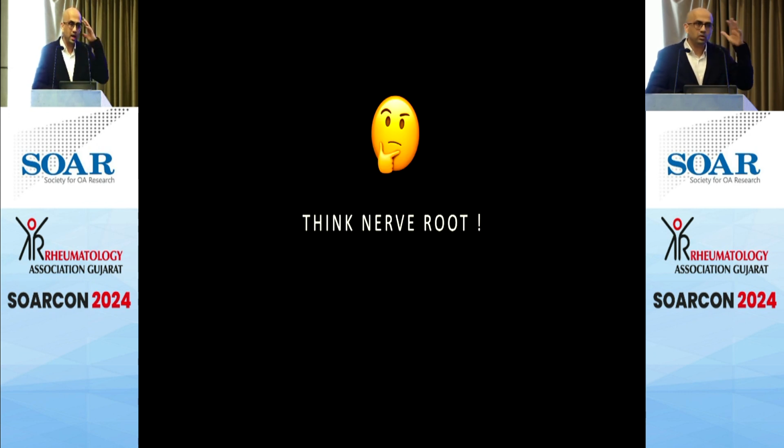So when I look at MRIs for a person with a neurological problem, I'm thinking of the nerve root. I'm not thinking of the disc or the disc herniation or the stenosis or what kind of degenerative changes they have. I'm thinking which nerve root is getting compressed. So you always think which nerve root, and can that nerve root cause that clinical syndrome, is what you are thinking in your mind.